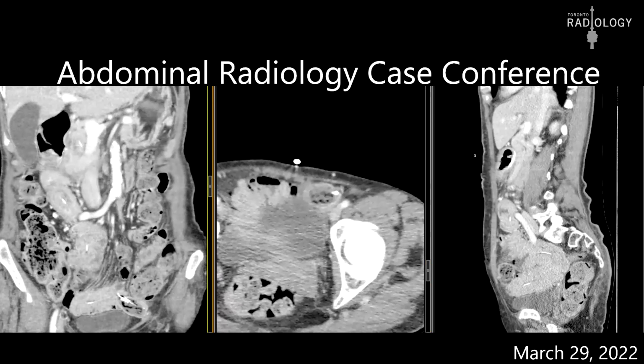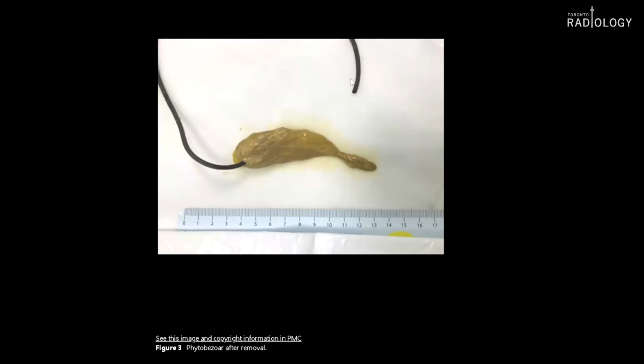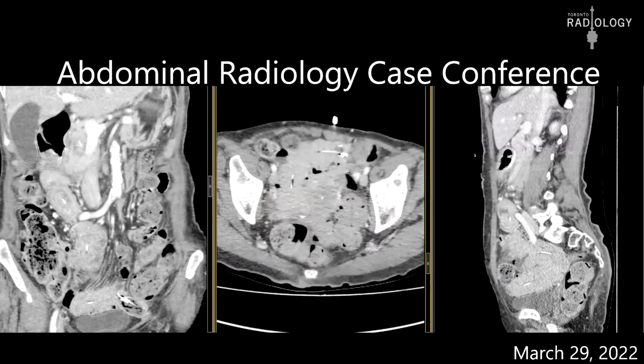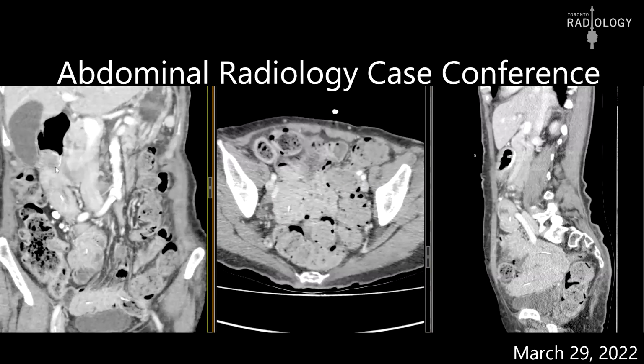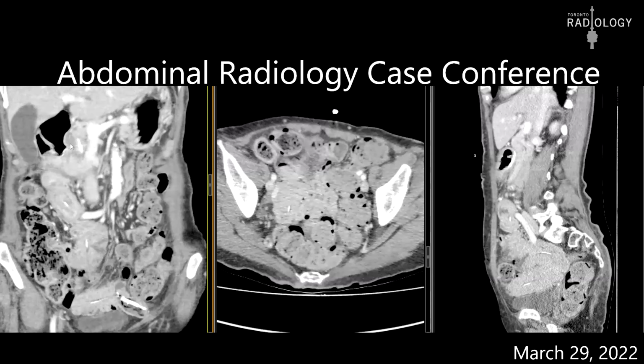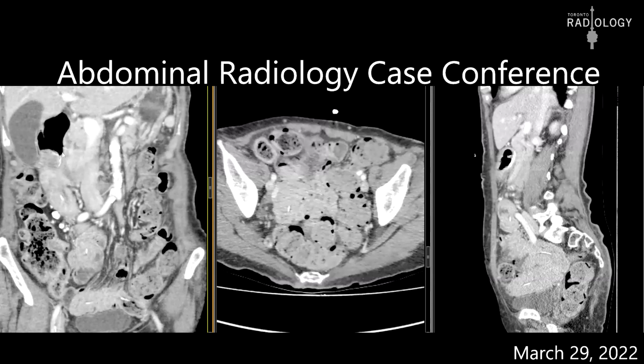Then I looked at other literature to see if it's common. This is something from the literature which I found, in which a Duodopa tube had phytobezoar over it. When they looked at endoscopy, they found similarly what we found. Basically, the tube was being pulled in. They couldn't get the endoscope too much beyond. And because it's being pulled in for a long time, there are chronic ulcers in the duodenum along the medial wall, wherever the tube has been stretched.